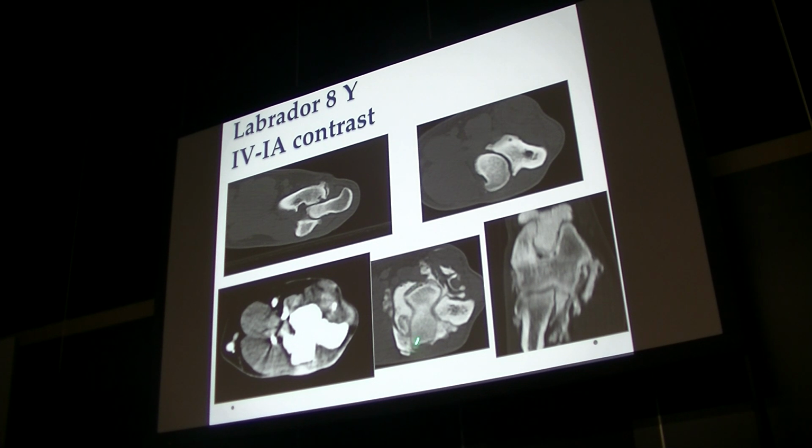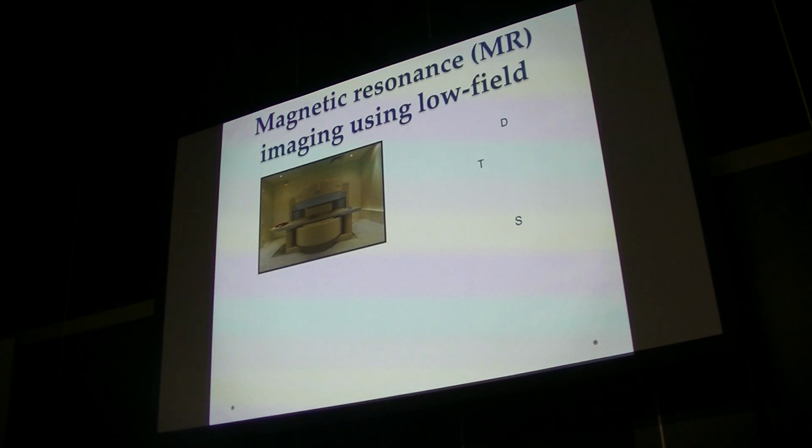And this is at the area of the distal humeral condyles, medial and lateral. The contrast is delineating the bony structures, it's leaving the joint and it's running outside into the area of the tendons. And you see nicely how the contrast delineates the tendons showing pathology. So that's something useful as well on CT.